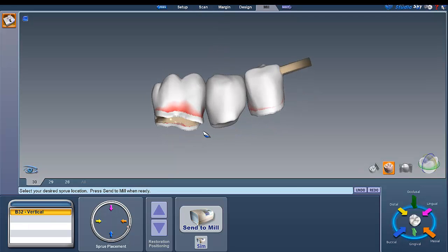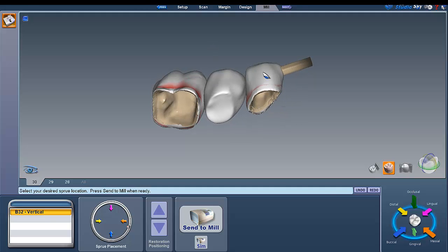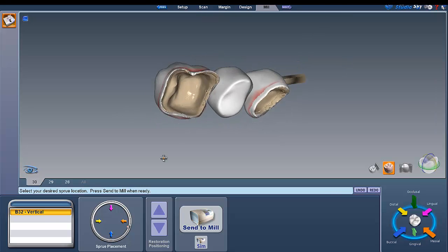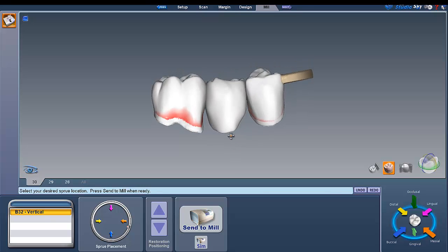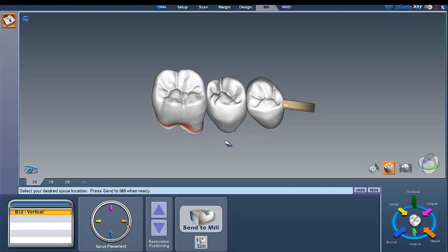And what I've been doing is setting 2 pegs into the tray, approximating the spots on the restorations, and then putting a little dab of object fix in there after I've got it all stained and glazed. I set it down on the pegs, and then just touch up the spot where we had the hemostat holding it, and then drop it in the oven, and it seems to be working out pretty well. So that's the design and mill portion of things here.